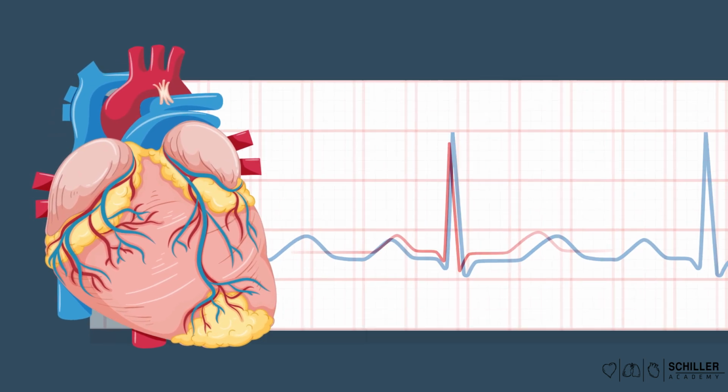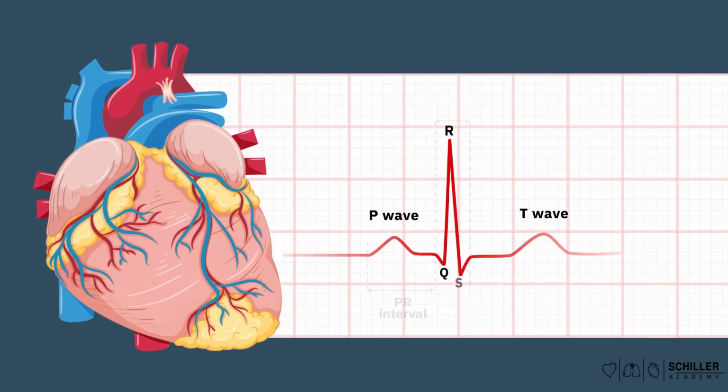The ECG graph is typically divided into segments, with each section representing different processes in the cardiac cycle. In some segments, the line shows an upward deviation, while in others, it shows a downward deviation. There are also flat sections on the graph.